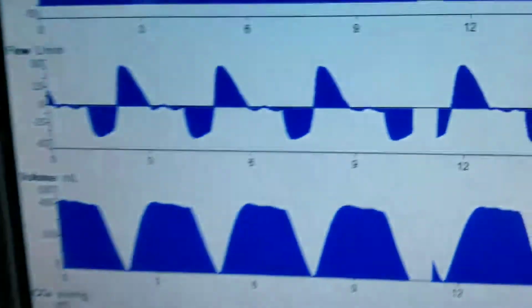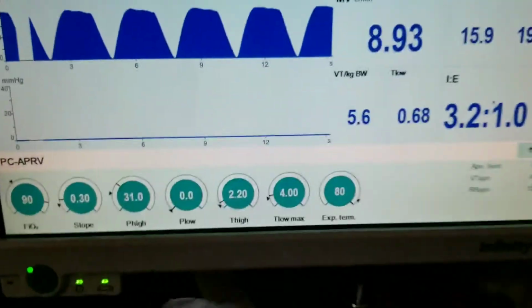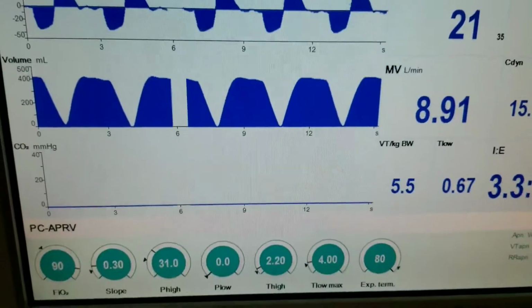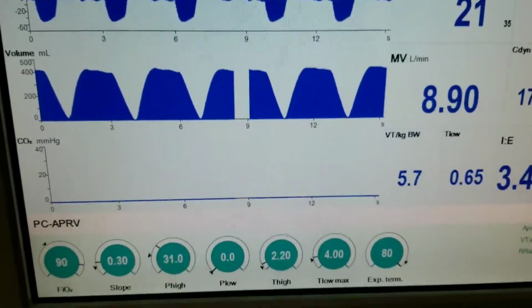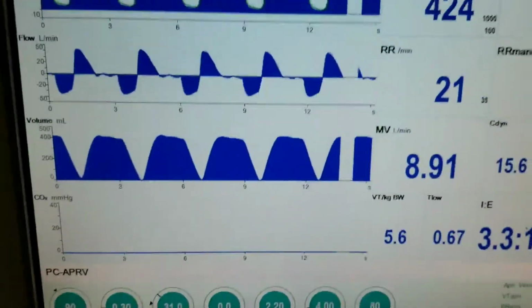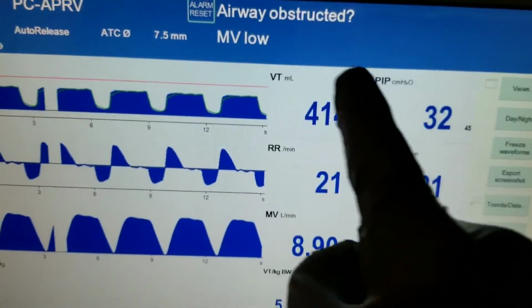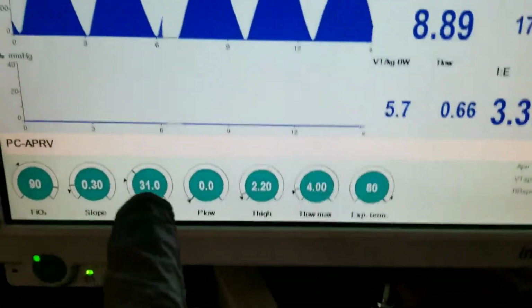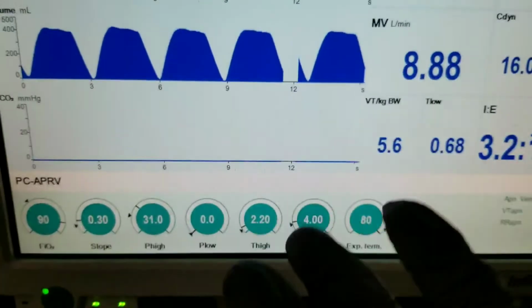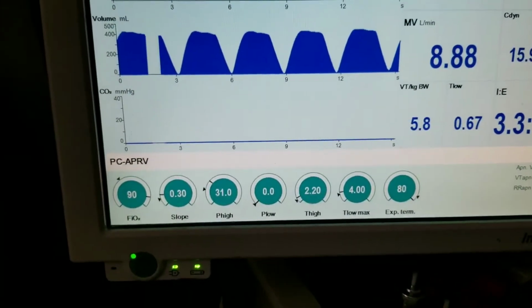It makes good sense, because if you looked at part 1, the tidal volume was pretty much about there, but we had a P high at 34. Now, we wouldn't be able to wean the P high that quickly within not even 24 hours, but we're confident to do that, and we're confident we're not running into trouble. The patient has the same tidal volume with plateaus that are almost getting within safe regions. We weren't too worried about the 34 initially when we first put this, and this patient's been on it for quite a long time, the 34.